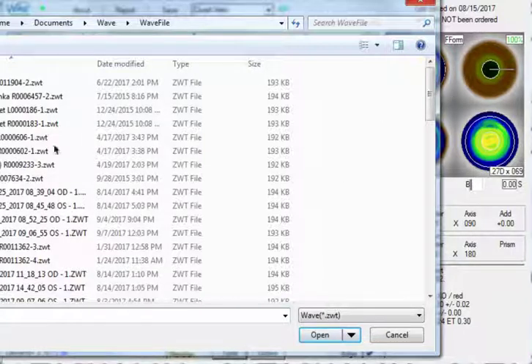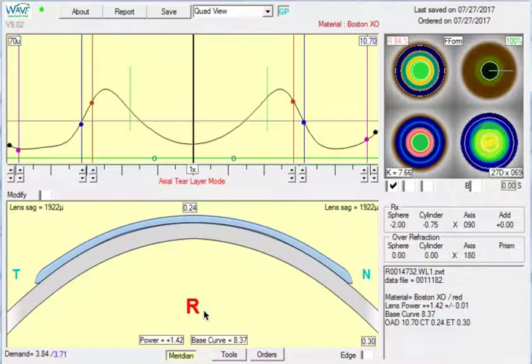But you just scroll through and find your patient, make sure you select the correct eye and the correct lens number. It should be -1, like it says here. Your GSIM lens will be a -2, and then you just hit open and it'll bring that lens into your window. And then you should have a display something like this.